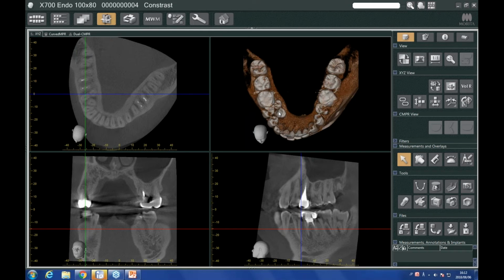So one of the things that you can do with three-dimensional images is reconstruct two-dimensional images. Now here we've been focused entirely on X, Y, Z, your axial, your coronal, your sagittal. But of course, we can go ahead and look at a reconstructed panorama. Now, I want to go back to my original contrast adjustment again, which gives me my original orientation.